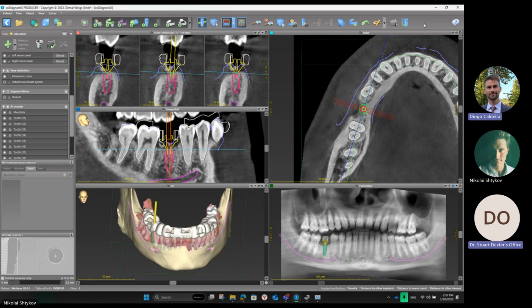Perfect. Thank you. I had two questions related to the sleeves. On the difference between the metal and the plastic, if you could explain that a little bit more. And then also, when you are adjusting sleeve height between H2, H4, and H6, when I was watching you move that sleeve, does it automatically move into those three preset positions? You can't, because with the drill system, you can't randomly position that sleeve. So does it automatically just go 2, 4, or 6 when you're moving it?